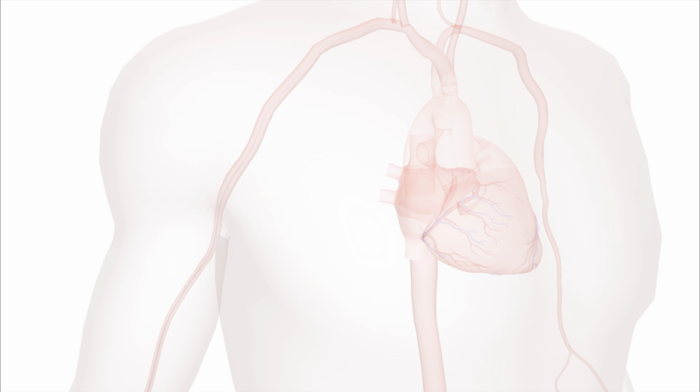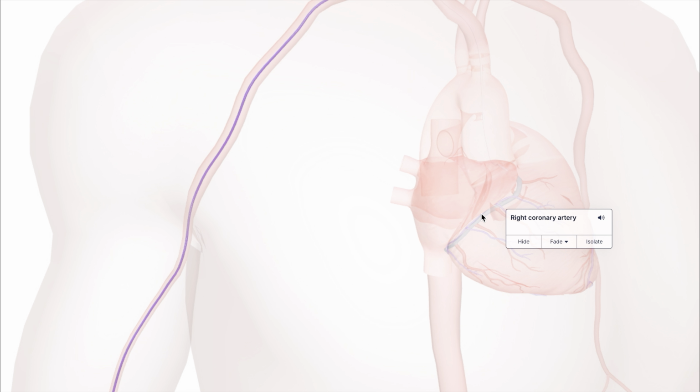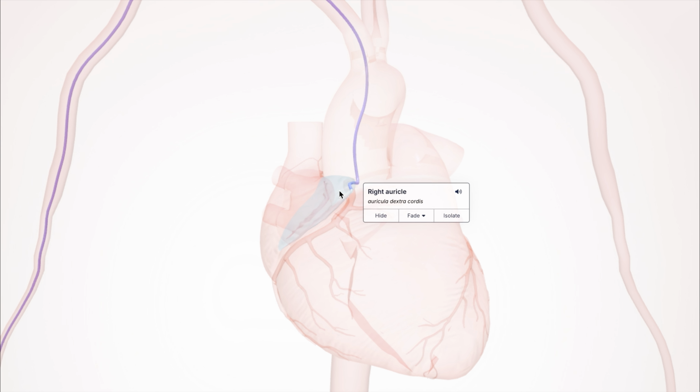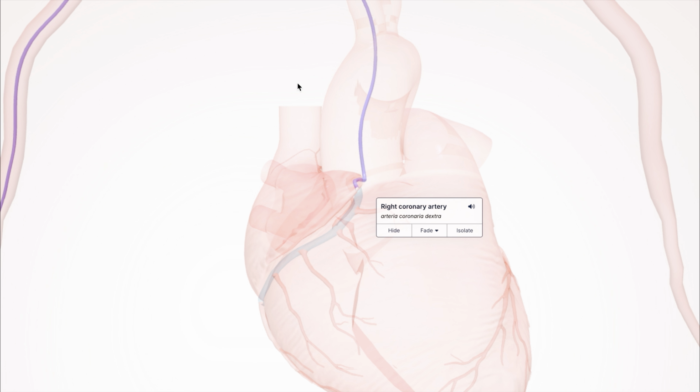In heart catheterization through the radial artery, the catheter continues up the forearm through the radial artery. Catheter advancement to heart. From the radial artery, the catheter travels up the arm through several connecting arteries until it reaches the heart. Once in the heart, the catheter can be used to evaluate a variety of conditions, including malfunction of heart muscle, heart valve disease, and coronary artery disease.